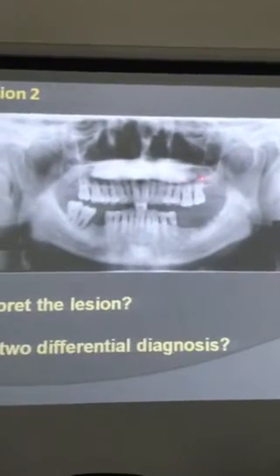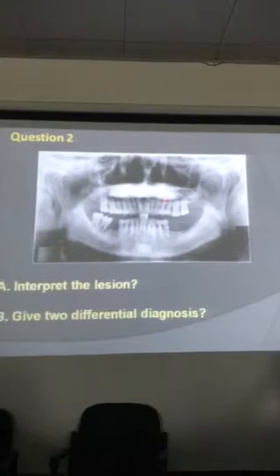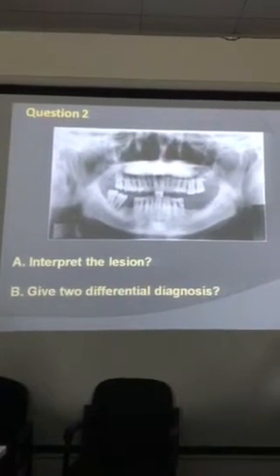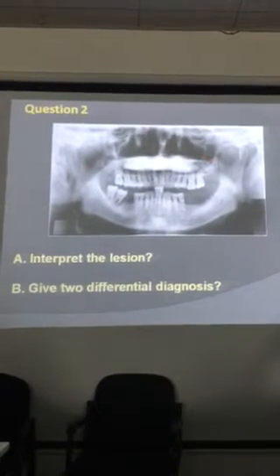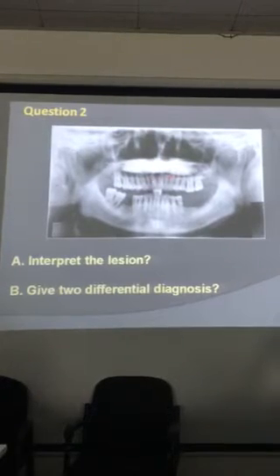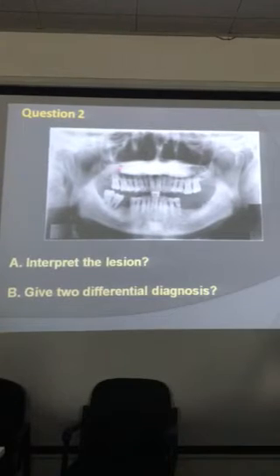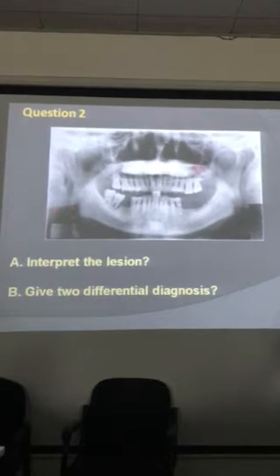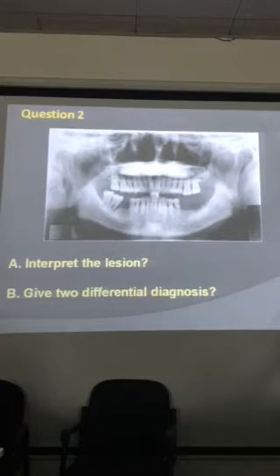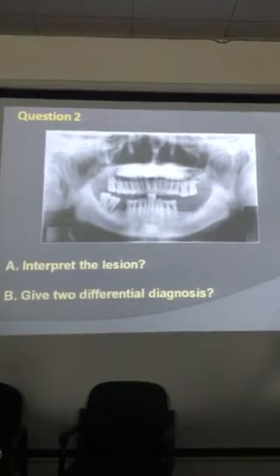You can see through this opacity. You can see the shadow of the root apex. Can you see it? Yes. So there is no root resorption. So no effect. Extension. Anterior posterior. I think I discussed the same thing in the last class also, right? Anterior posteriorly, starting from the first molar of one side to the first molar of the opposite side. Superior inferiorly, starting from the hard palate till the periapex of the maxillary molar teeth.